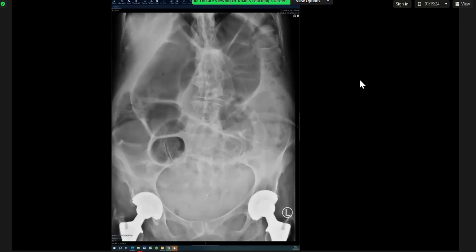Maybe the distended bowel in the center of the abdomen corresponds to the transverse colon, because I can see, I don't know if you can see my pointer or not, but I can see it approaching the course of the left transverse colon and traversing in the left paraspinal region. This may correspond to dilatation in the right colon and in the transverse colon too. Okay. So I'll move on to the CT and then I'll come back to the X-ray to explain.